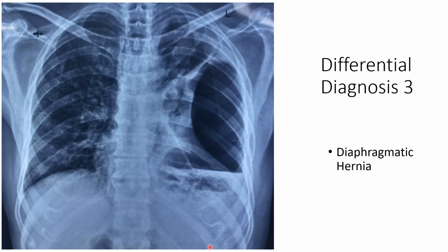The key important thing is that when you see multiple air-fluid levels, we have to be a little bit careful. We have to take a CT chest to confirm what the finding is, because the treatment for hydropneumothorax is ICD insertion. But if you find cases like this, you have to be careful, because if you put an ICD into a bowel, it can be catastrophic.